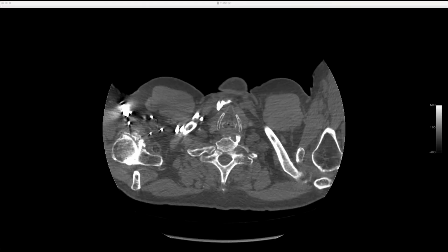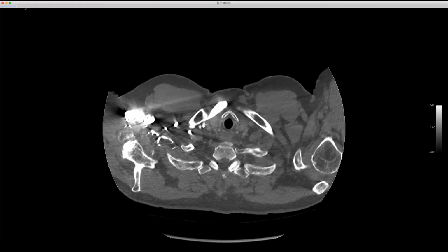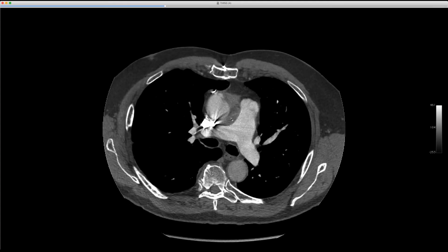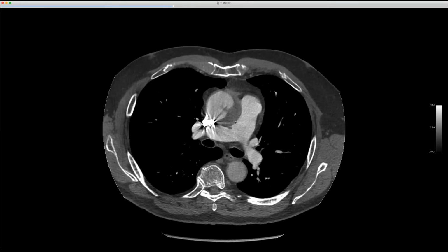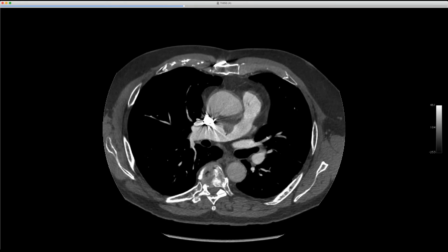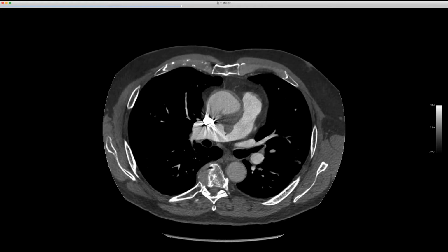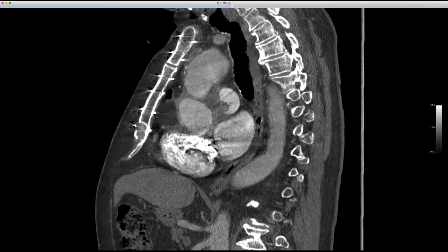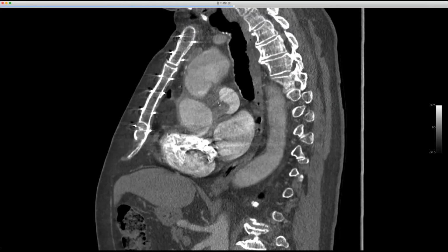Now this is the case I sent around to you guys that we've talked about over here for a while. I have very little history other than that this patient had an ascending aortic repair in 2005. And you can see there's a graft there and no symptoms as far as I know, but there's this collection here. This is recent imaging, and then this funny filling defect that appears to affect the right pulmonary artery. And I'll put a sagittal up. There's the coronal. And Seth had said he'd seen this before, right there. And we were wondering, was it a pseudoaneurysm that was eroding in, or is it just some of this collection indenting on the pulmonary artery?